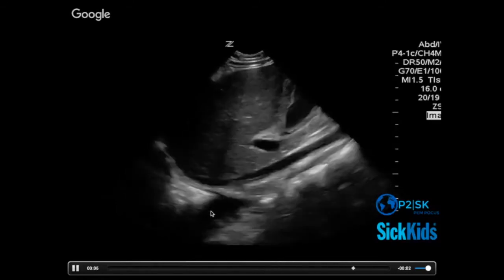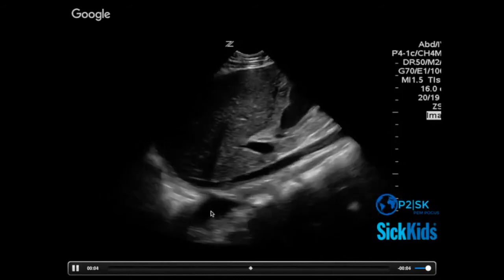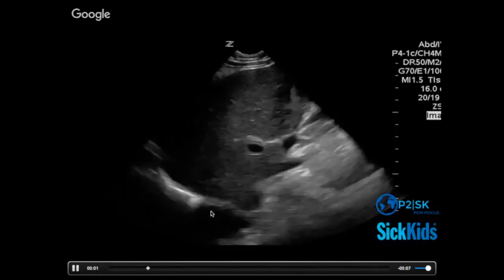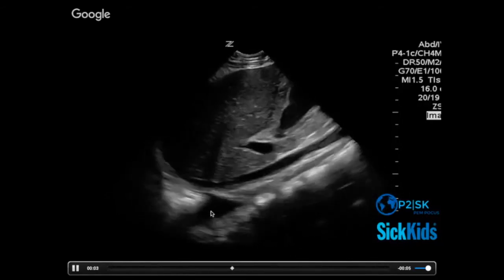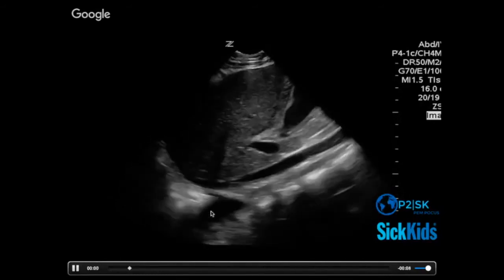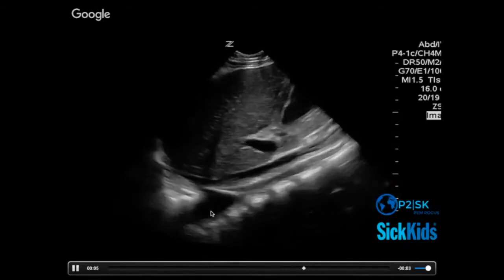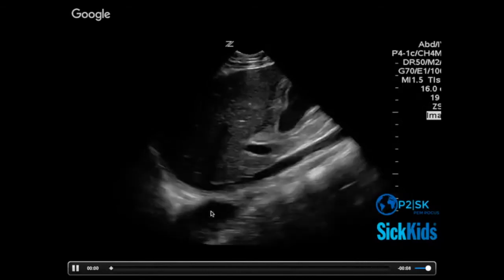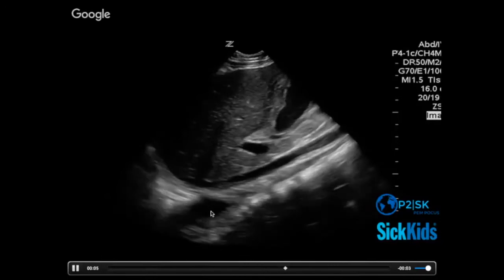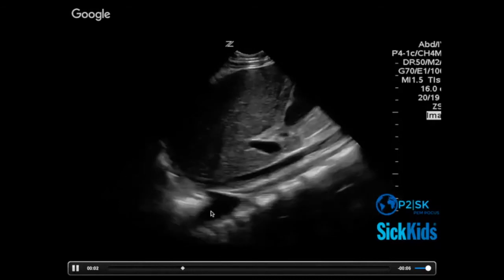Okay, so then this patient who's gotten a number of boluses has a non-plethoric IVC and a pleural effusion. So what do you guys start to think about causes of this picture? Capillary leak, I hear. Yeah, good. So now we're going to do that thinking shift from diagnostic to therapeutic. Good. So maybe this is a kid I need to switch to pressors, right? They're still shocked. They've gotten 3 boluses. Why can't we give another? Maybe we can't give another because it's just going to accumulate in their chest.